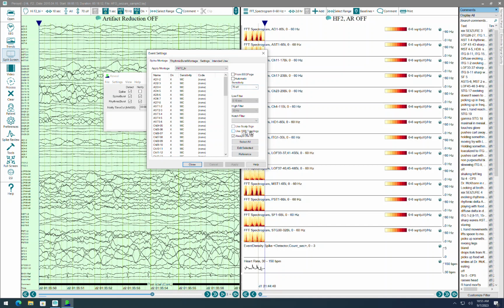We're not going to use 1020 topology. There is none. And the other thing I want to do is sort by code, because in some channel labels, it'll read the input as either temporal or eye blink channels. Obviously, there's none of that in the intracranial, so these should all say none. And if I scroll to the bottom here, I do see EKG inputs, and I do not want to run spike detection on that because it'll find lots of spikes in the EKG channel.